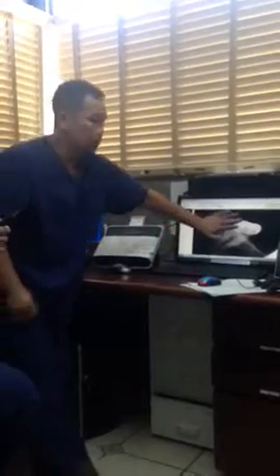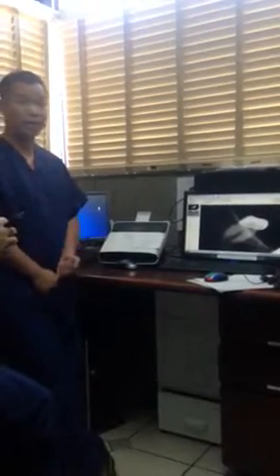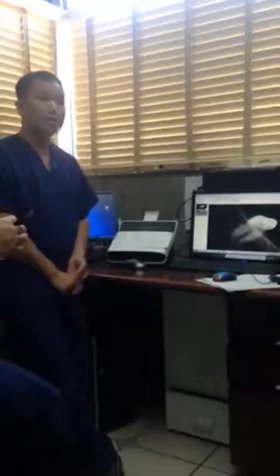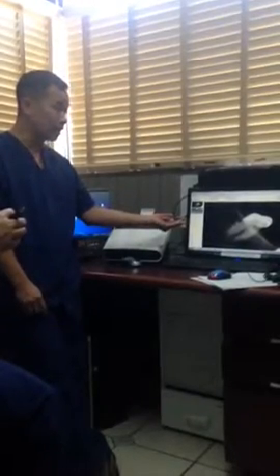So, Mr. Insurance, you can look at this. "Oh, Dr. Nguyen, why did you do a root canal on the tooth?" Well, the patient was in 8 out of 10 pain. She had cold sensitivity previously, and last night it got so bad that she couldn't sleep. "Really, I don't see any decay or any infection on your x-rays." Okay.